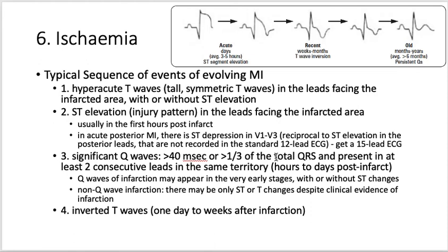And then after all of this, days or weeks later after the infarction, you'll start to see inverted T waves afterwards. And then here is just an example of a pathological Q wave. As it gets older, you get these deep Q waves, and those are pathological.